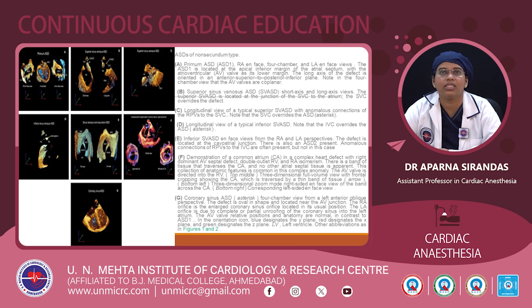And this is ASD of non-secundum type. So the A figure shows primum ASD. One is the RA en face view, 4-chambered, and LA en face view. The ASD is located at the apical inferior margin of the atrial septum, with the atrioventricular valve at its lower margin. The long axis of the defect is oriented in an anterior superior to posterior inferior plane. Note in the 4-chambered view that the AV valves are coplanar.